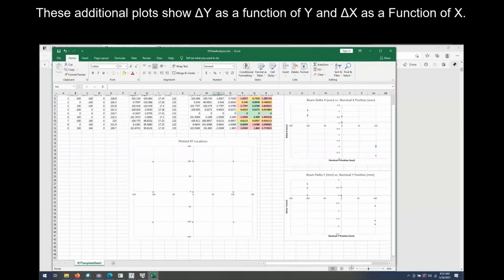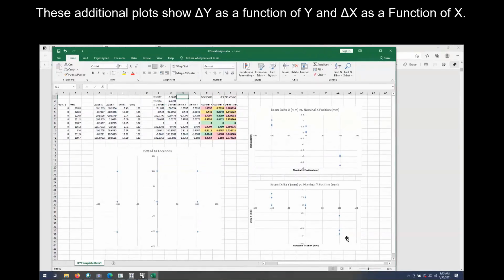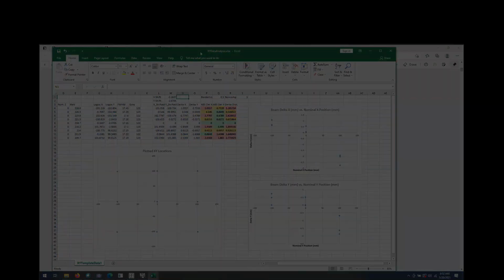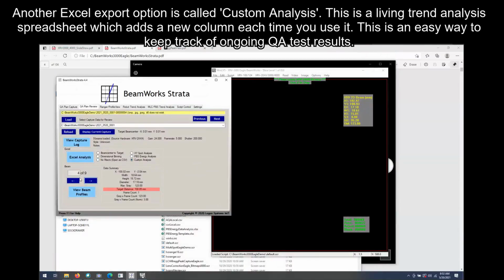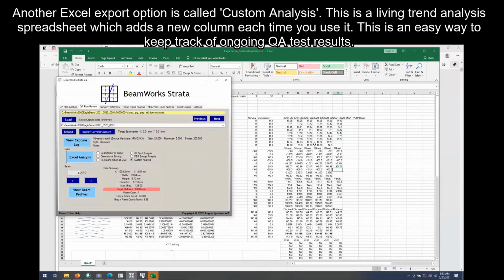Over here, we've got a couple other graphs. How bad is your X or how bad is your Y axis? I think these beams are just placed by hand. So we have another type of script that'll go through, and it should build up over time.